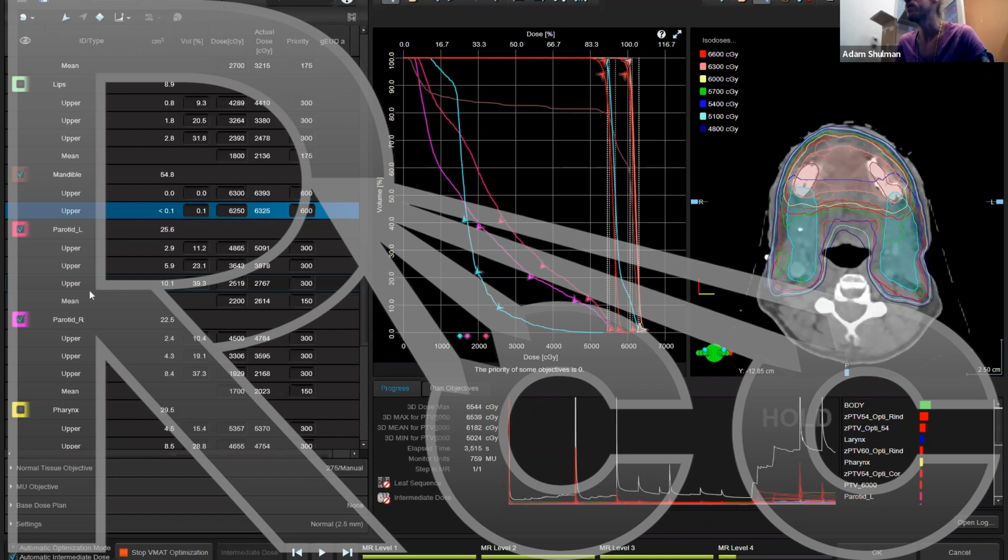I've recently approached a vendor about using this concept. The idea is that if you can draw with a marker, different color markers, exactly where the isodose line should be, then you don't really need AI to accomplish a great plan. You just need math and dose fall-off and contours.